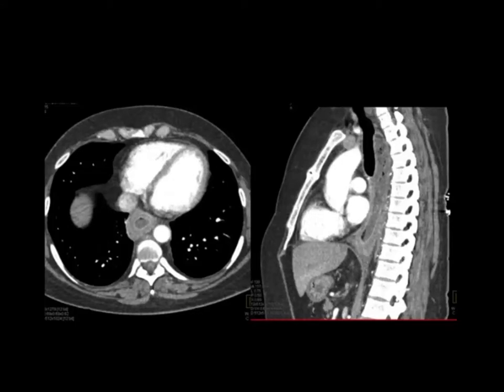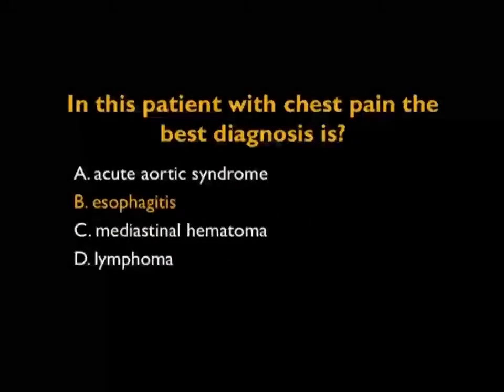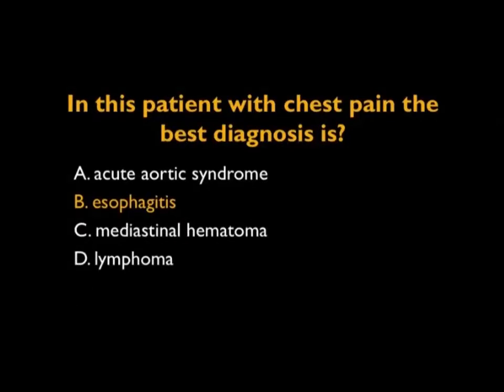And what about lymphoma? I don't see adenopathy, but what I do see is thickening of the lower half of the esophagus. What could this be? I guess in theory, this could be an incidental carcinoma of the esophagus. That's a possibility, and I couldn't exclude it. However, when I see a markedly thickened esophagus with this mottled enhancement, I'm thinking of inflammation. This indeed was endoscoped, and this was esophagitis. There was no evidence of any tumor detected in this patient.